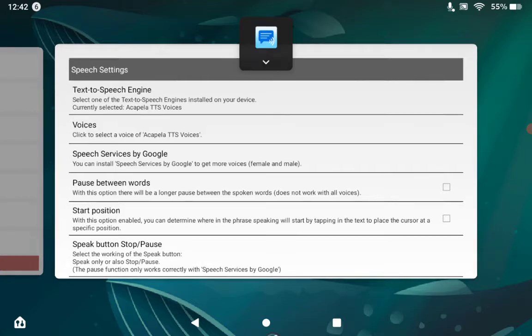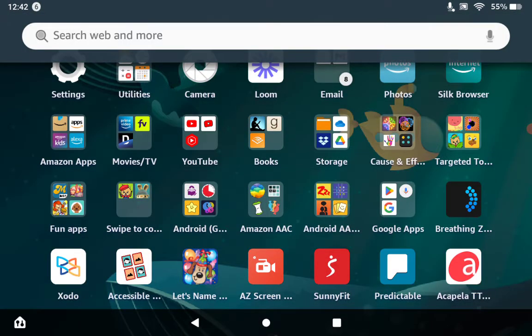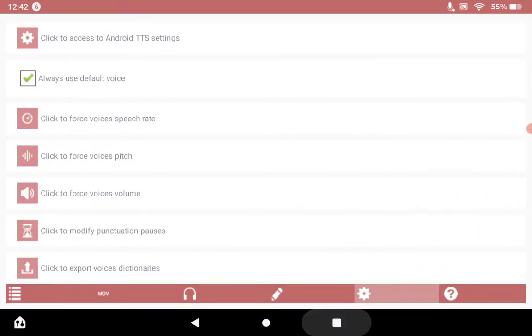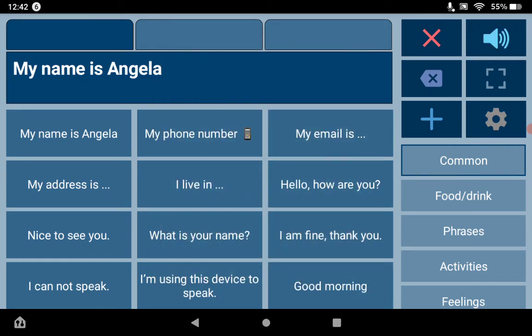So actually, let me show you how to switch to Josh. Let's back out of that. Done. My name is Angela. And you're going, that's still Ella. Took quite a while to figure out what I need to do to get it to actually switch to Josh.